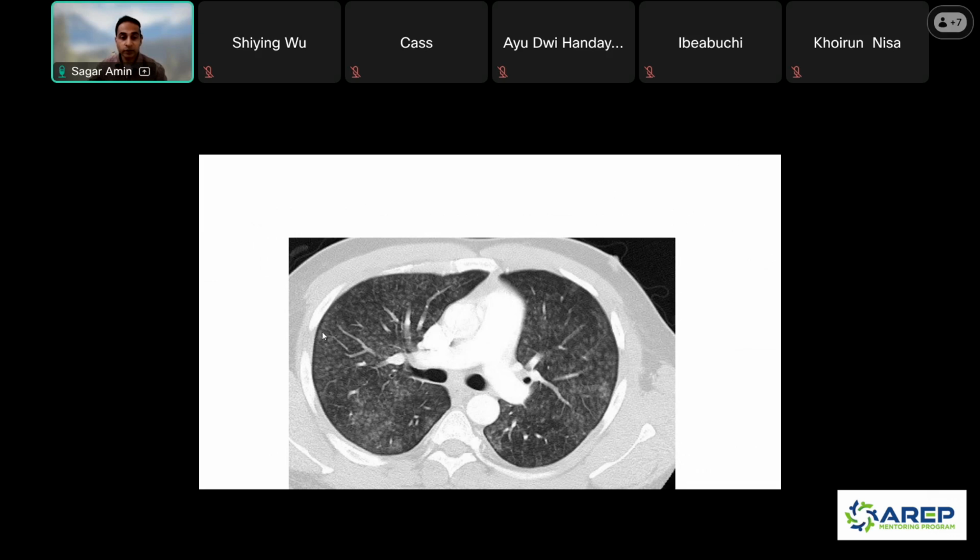And because of that, since it's sparing the periphery and you have good intervals between each one, this is in a central lobular distribution. It's sort of like coming out like a cotton ball. So maybe it looks like diffuse cotton ball type ground glass central lobular opacities. So pretty extensive. Things that can cause that could be an infection. It's pretty diffuse. So in this case, I'd also be thinking of an entity called hypersensitivity pneumonitis.